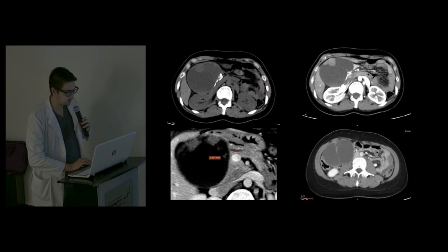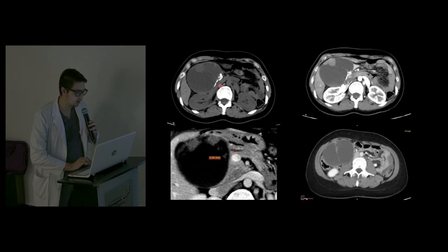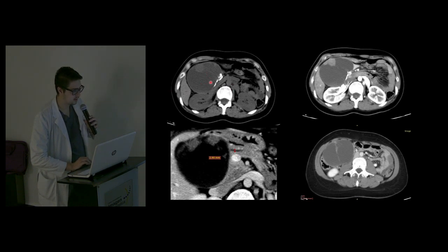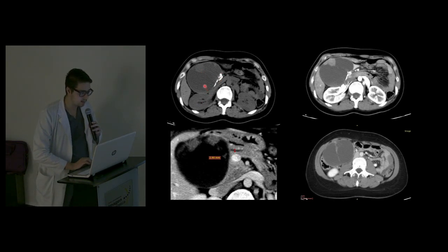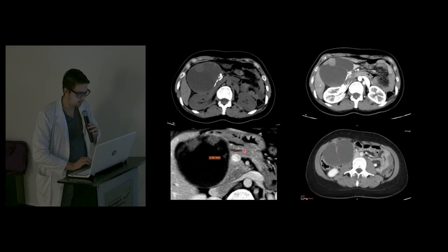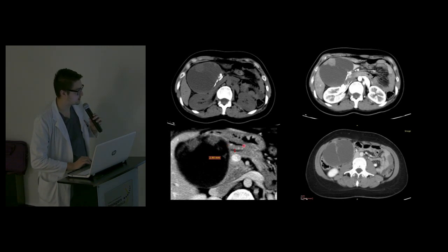At the CT we have three axial images. This is our oblique reformatted image. In the non-contrast phase, we find a rounded, well-defined mass which has a cystic portion and solid portions. This also has dystrophic calcifications. The solid part has relevant enhancement after the contrast administration. Also it has thick septa. And a very important finding in this patient was that the pancreatic duct wasn't dilated.